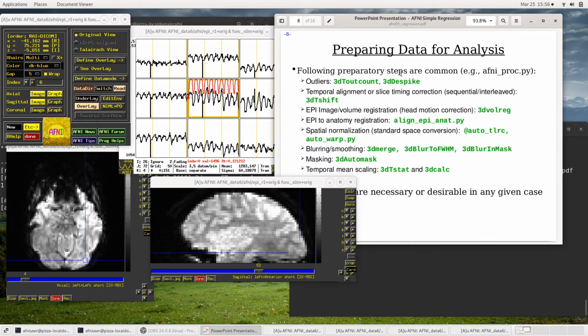And so we might even feed the results of that to afni_proc.py rather than computing it inside. But again, that's for a different session. At this point now, everything is aligned, hopefully. We'll have to review that, but in theory, that's the point of the step. So the EPI is aligned with itself.